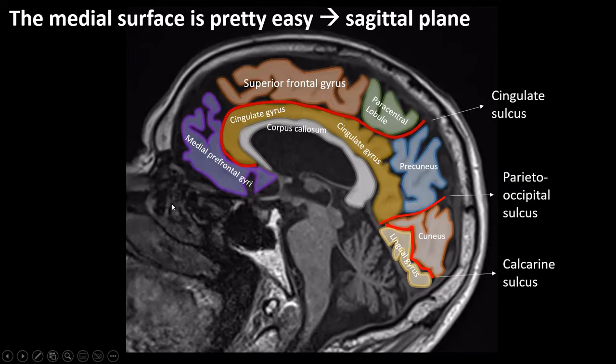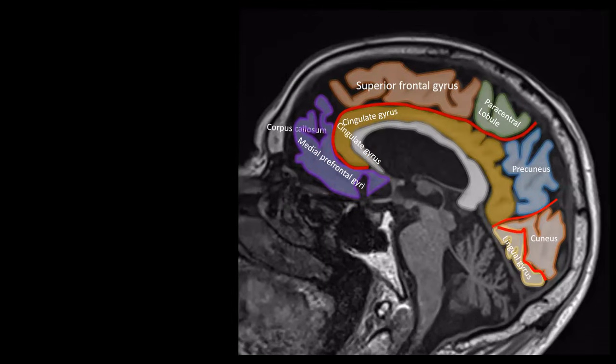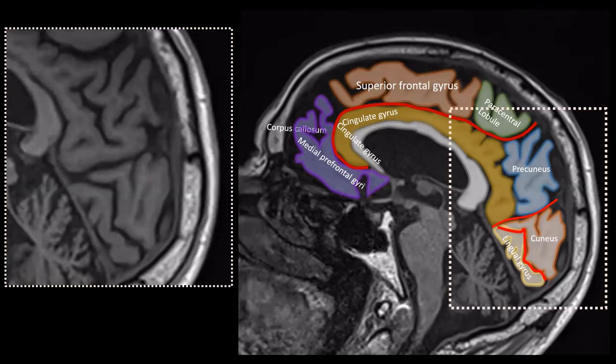Well, if you have nice sagittal images, that is. So something went wrong here, obviously, but I'm not going to correct that now. I can edit it out, but I don't think I will. I made a magnification of the occipital lobe. And why did I do that?